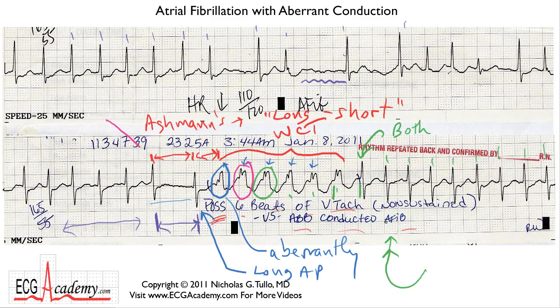Well, we'll talk about ventricular tachycardia in the next section, and that'll finish this course in basic arrhythmia analysis in the ECG Academy. But in the meantime, I hope you enjoyed this kind of high-tech discussion on atrial fib with aberrant conduction.